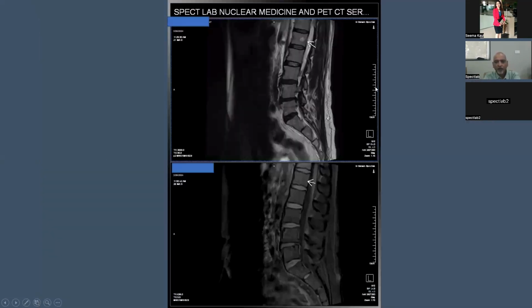We did an MRI. There was a single lesion of 5 millimeter on MR in this. So this was not a conclusive scan for myeloma, because you need to have at least 2 demonstrable lesions on MRI to call it light chain gammopathy or early myeloma.